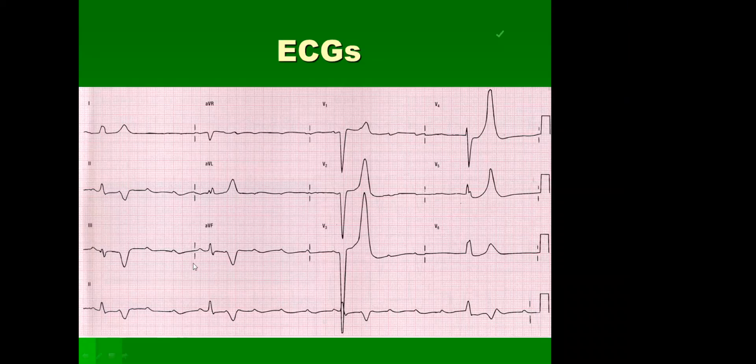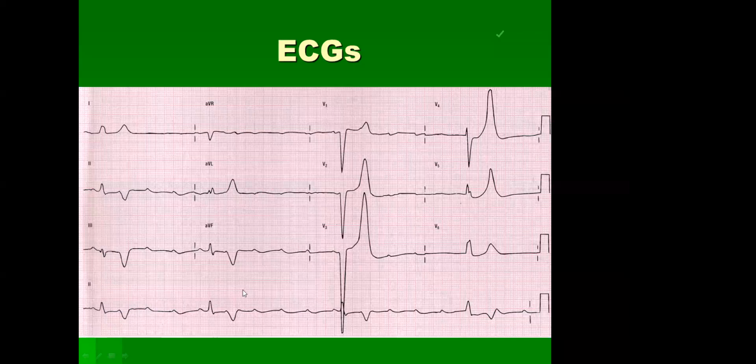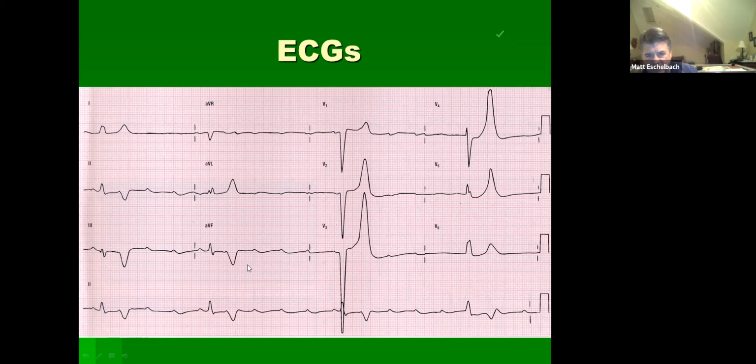Let's see. Here. This is 3 seconds, 6 seconds. So 1, 2, 3, maybe 35 at best. All right. So if we have, let's go back, here's a beat one. What's missing here? We're missing a bunch of QRS complexes. Yeah, we're missing a whole bunch of QRS complexes.